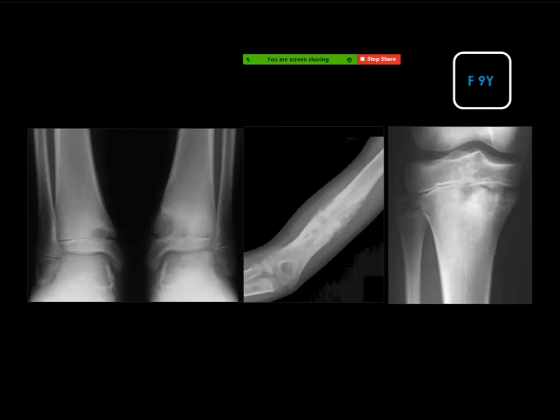The humerus looks like infectious osteomyelitis. Okay, apart from that, you should consider all as infection because you don't say that the patient had inflammation of the other lesion. Sorry, what do you say? The other lesion I think it's neoplastic, but the humerus I don't know. This sclerotic lesion, this lesion you mean? No, the humerus. The humerus is infection or tumor? I think it's neoplastic.